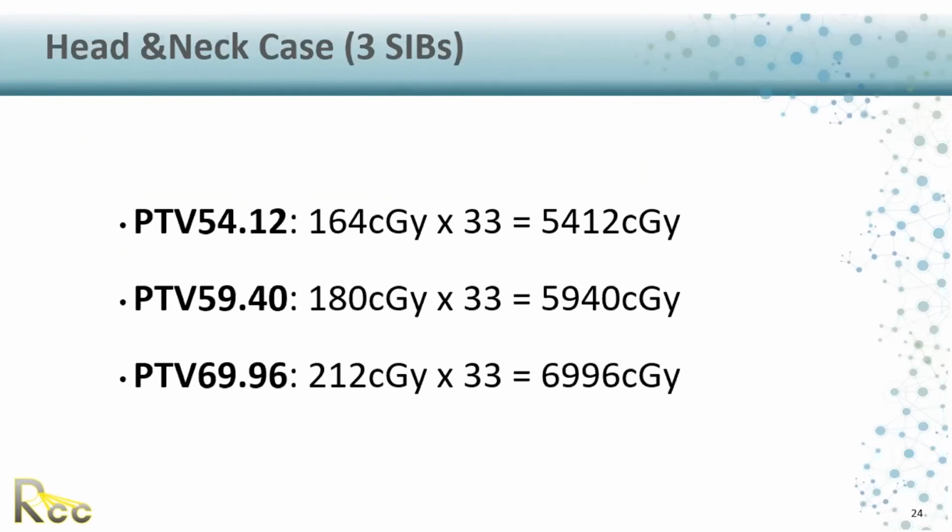Okay, sure. So for the SRS, usually you are delivering a high amount of MUs, let's say 21 grays in one fraction, or 21 grays in 3 fractions. So you can use 21 as a single fraction, or 21 in 3 fractions, so you have 7 grays per fraction. If you use 600 MUs per minute, then the treatment time will be very long, because 600 MUs is not enough to deliver your 21 grays in the full rotation of your arc.